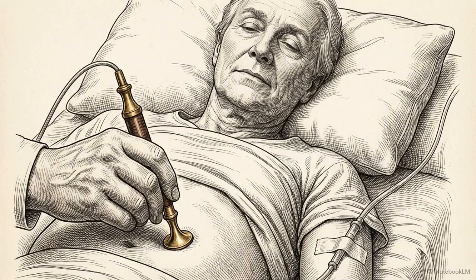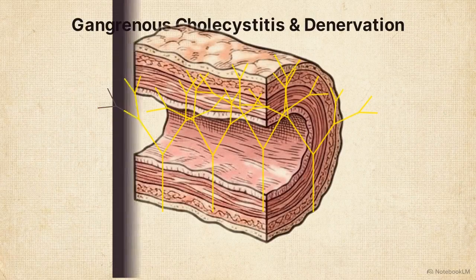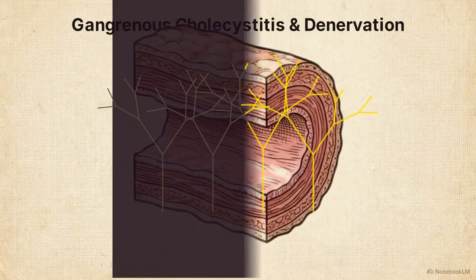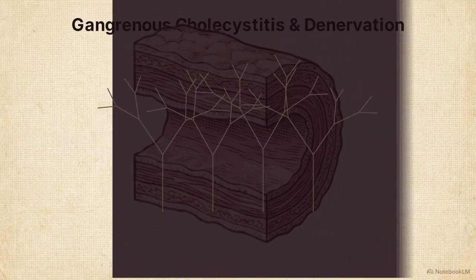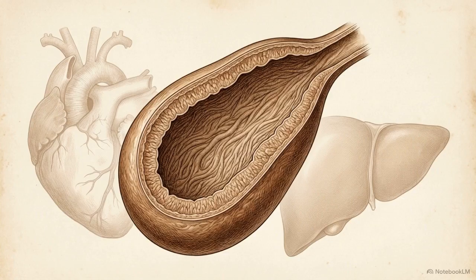The sonographic Murphy sign yields frequent false negatives. A patient's pain response can be masked by analgesic medications or blunted by conditions like diabetic neuropathy. In advanced cases, gangrenous cholecystitis can completely denervate the gallbladder tissue, eliminating the pain response entirely, even as the condition worsens. Generalized wall thickening is similarly problematic. While common in biliary inflammation, it lacks the specificity needed for a standalone diagnosis.